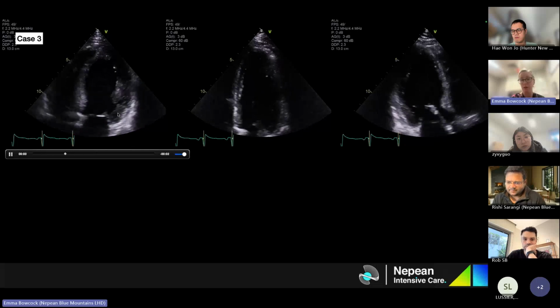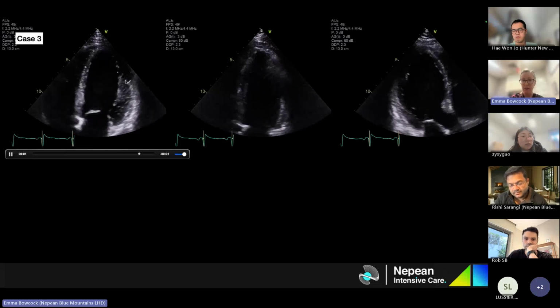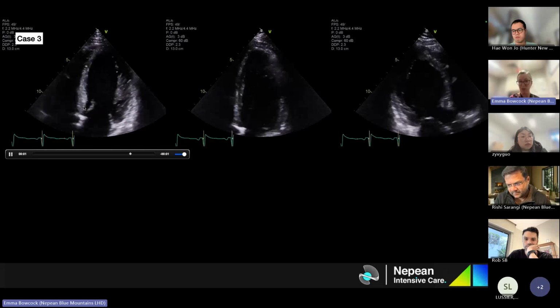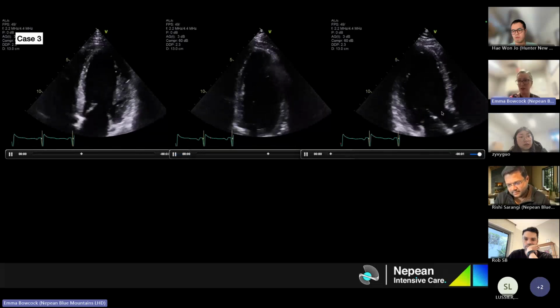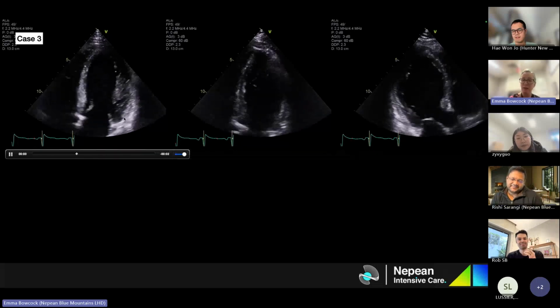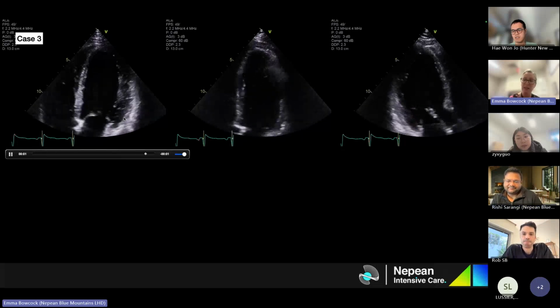So really just go through them and just say, the basal anterolateral wall looks normal, the rest of it looks akinetic, the apex looks normal, the basal inferoseptal region looks normal to hypokinetic, but the rest of the wall looks akinetic, etc., and just go through the rest of it like that. You did say that the anterolateral wall looks edematous, which obviously takes you down a slightly different path, of myocarditis and all that stuff.